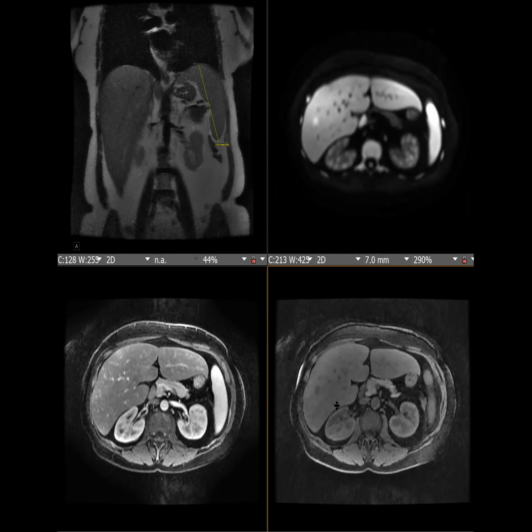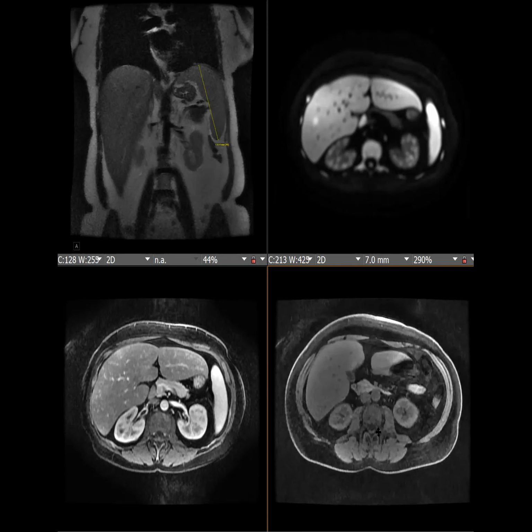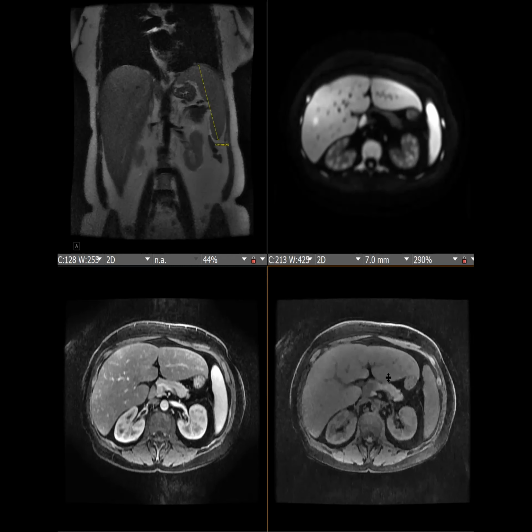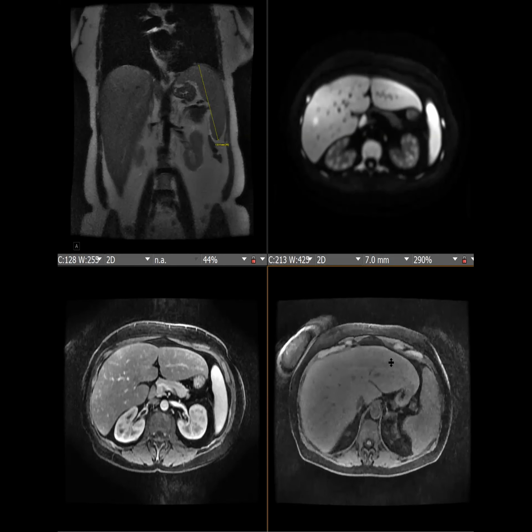You really can't. It's blending in. You see that lesion that they were asking us about, but if you had blinders on or were reading very quickly, you could miss the larger process that's going on. So this was a really great case, and I just wanted to share that with the group.